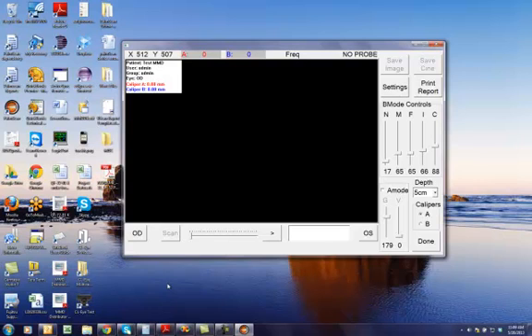Okay, next we are going to plug in the USB mobile PalmScan probe into the system. And on your system, if this is the first time you have plugged in the USB probe, the device will go through the installation of the probe USB drivers. It will take a few seconds and then you will get a message that the installation has been completed and the device is ready to use. It's important that during this time you do not unplug the USB probe. If this happens, the drivers will get corrupted and you probably have to reboot your PC before you can continue.